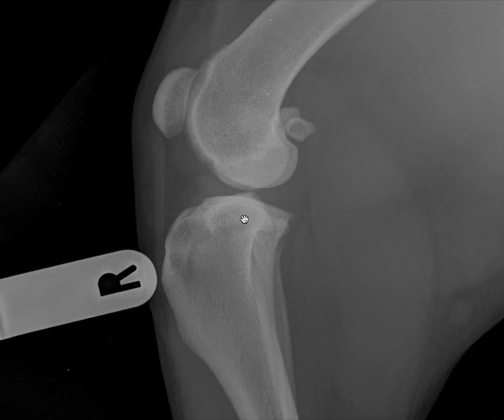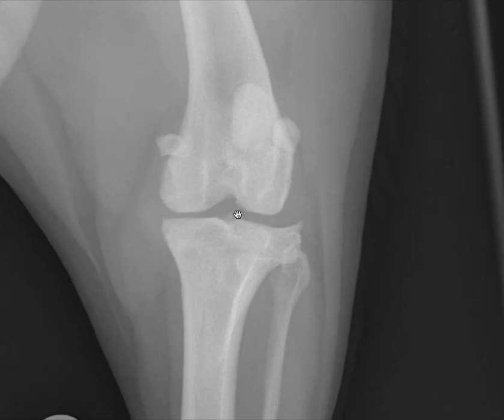So I would conclude in this case that there's a moderate increase in synovial volume, which could be due to synovial effusion or, for example, capsular thickening. We're not able to differentiate the cause from radiographs because all of these structures have the same opacity. I would also be concerned that there could be an acute injury to the cranial cruciate ligament insertion and that there are some signs of chronic instability, such as this osteophyte here.